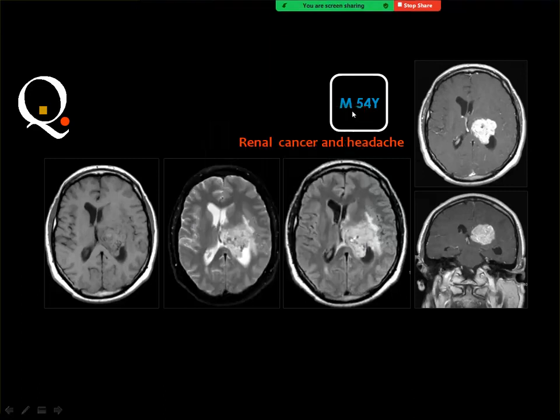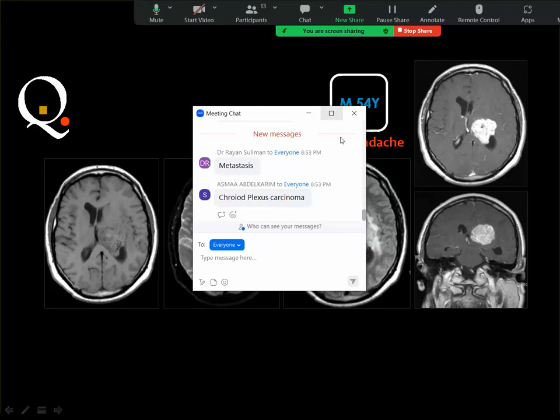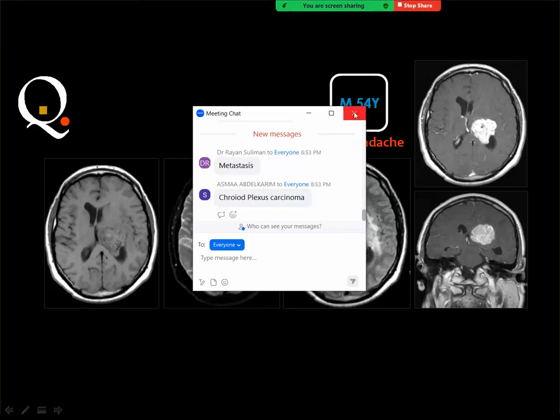So of course you have the right to diagnose this as metastasis because you know that the patient had a primary malignancy. But you should know that even in the presence of a known primary malignancy, the patient may have other lesions that are benign.